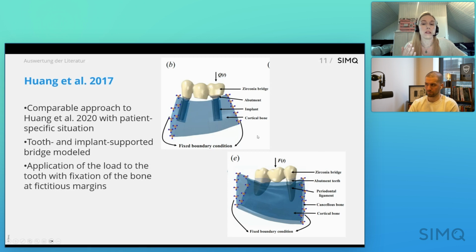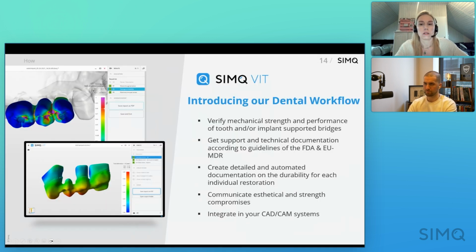But what's great is we've already done that foundational work. So we want to branch out and start developing even further, more detailed workflows for dental. So that's the difference there. And that workflow is similar to what the workflow with the screen was for the subperiosteal implant.